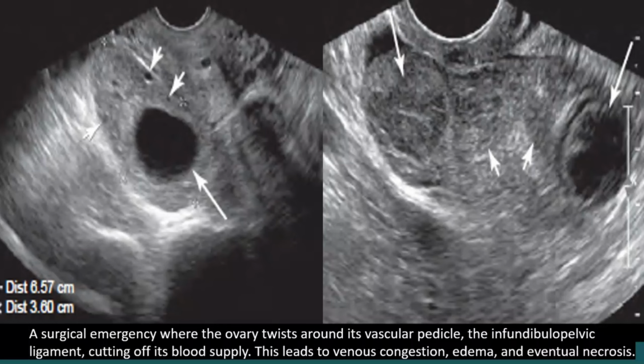Today we are going to discuss the sonographic features of ovarian torsion. Ovarian torsion is a surgical emergency where the ovary twists around its vascular pedicle and the infundibulopelvic ligament, cutting off its blood supply, and this leads to venous congestion, edema and eventual necrosis.